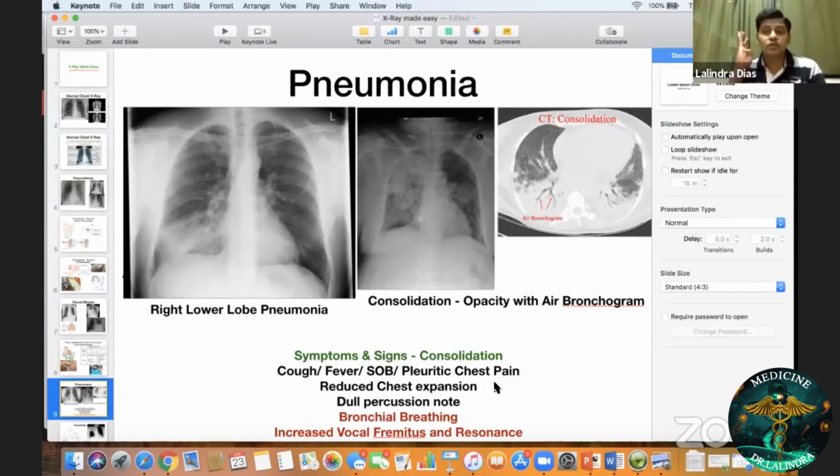Right. So we have covered two major areas in respiratory medicine. We now know how to identify a pneumothorax, the treatment, causes, everything I have covered. We also covered a case of pleural effusion: the clinical features, pathophysiology, pharmacological management, X-ray interpretation, and the causes of pleural effusion, exudate, transudate, all that we have done. The next white shadow is pneumonia, or you call it consolidation. Now, how to identify a pneumonia or a consolidation?